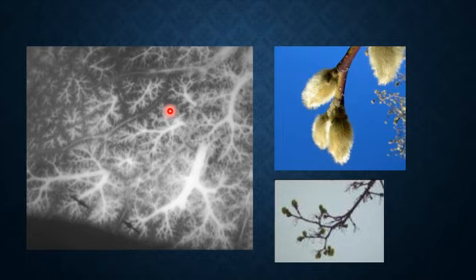Dr. Ahmed, tree in bud is usually patchy, not diffuse, according to the pathology. For example, if it is aspiration, you'll see it somewhere in the right lower lung lobe. If it is TB, you might see it scattered here and there. It depends on the cause of the tree in bud.